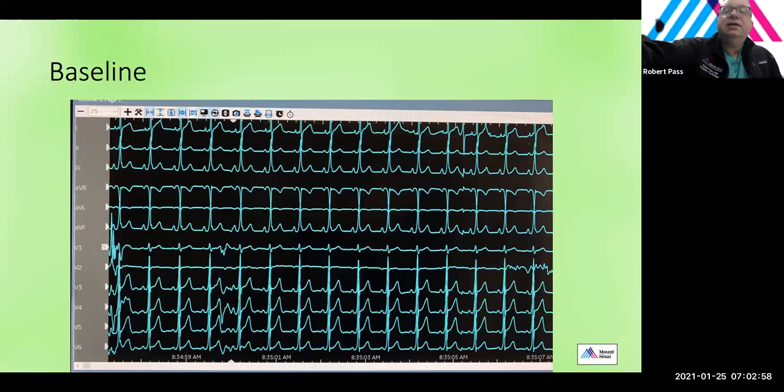And I think that in retrospect, the patient had had it for so long that they didn't even recognize what was abnormal. So you can see that the patient is pre-excited. It's not very pre-excited, so the pattern is difficult to ascertain from just the surface electrocardiogram.